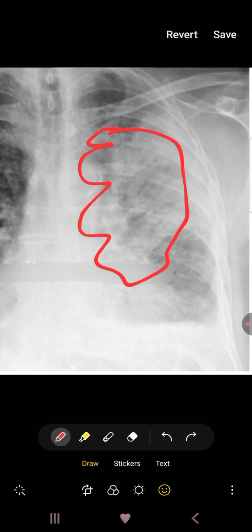So today we did consolidation with air bronchogram on chest X-ray. This was a video on the abnormal chest X-ray, and I also told you the differential diagnosis of consolidation. Whenever someone asks you the differential diagnosis of consolidation, now you know it always occurs when your alveoli or small bronchi become filled with something, and the differential diagnosis will be pneumonia, pulmonary hemorrhage, pulmonary edema or cancer.